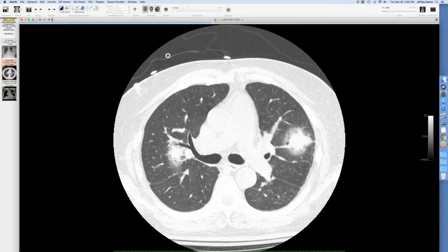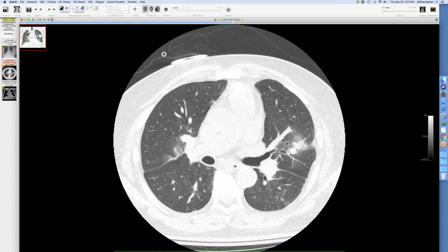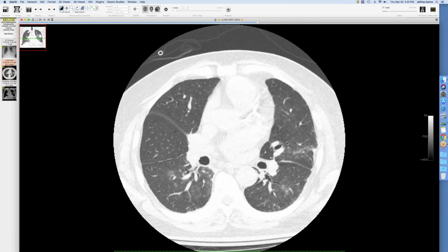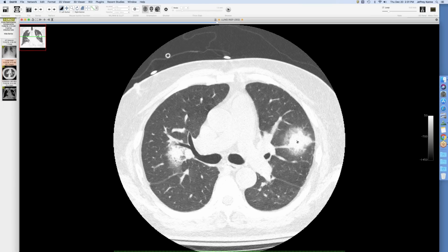So micdadei is the classic one for giving a fungal-looking nodule with a nice halo, but it comes on faster than fungus. Right. So a super fast fungus is often micdadei. I've seen one case of pneumophila that had this, and this is the second case now. Yep. With that micdadei pattern. And they confirmed the species and everything. Yeah, that was my first question when I saw Legionella, was it micdadei or not? Because I have a couple cases, and you've shown some that look like a big halo sign.